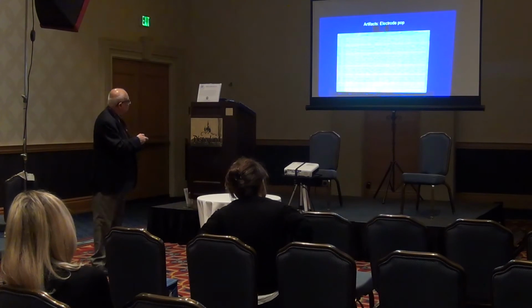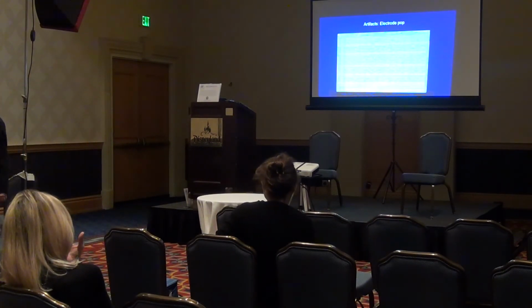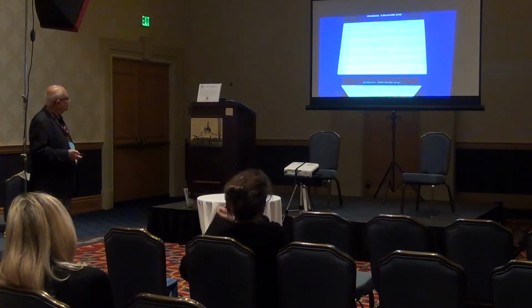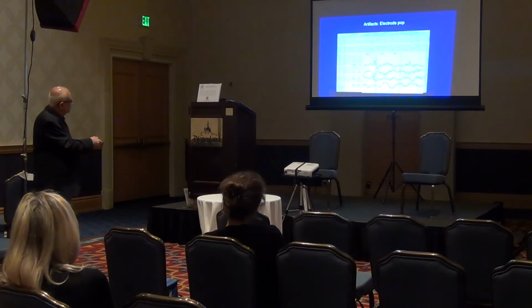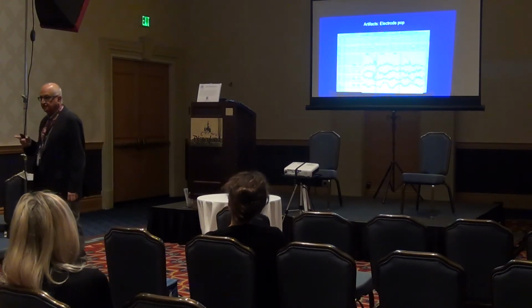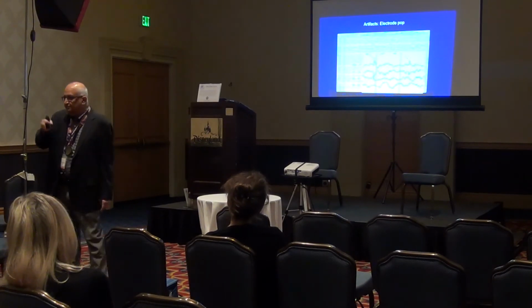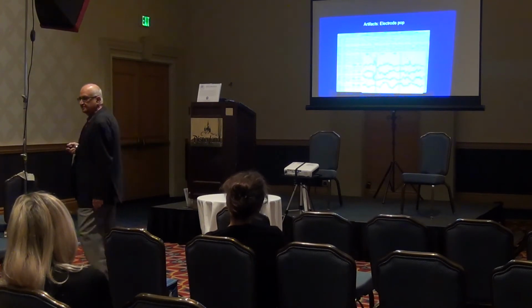Then you see these very, very sharp things. When you see super sharp things, they're never from the brain. There are two causes for very sharp things. This one here, shown in magnification. You see that rise time? How fast that wave goes up? That's never cerebral activity. Two things do that. One is electrode pop when it's isolated like that. Or like earlier you saw that really busy looking stuff, that's just EMG, muscle activity, right?